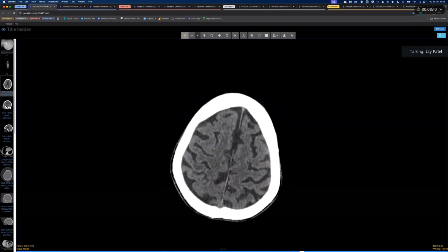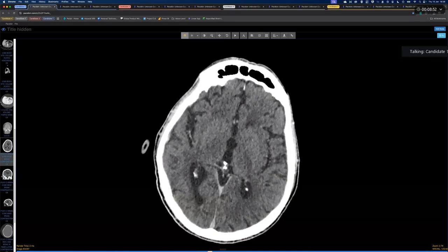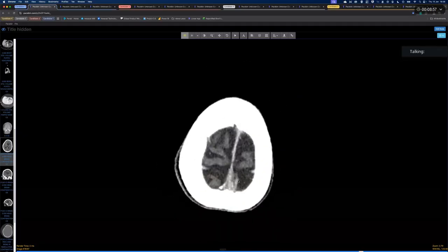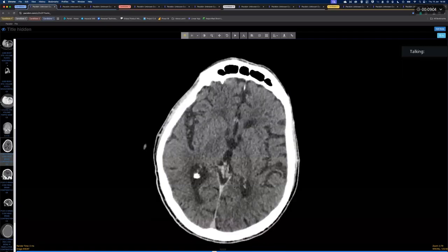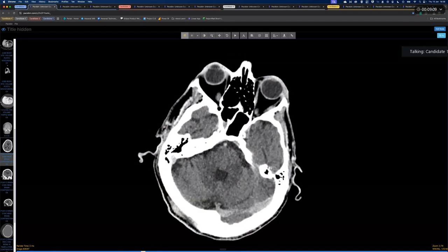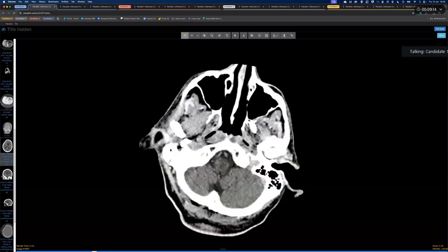Okay, thank you. I'm just going to take control of the mouse for a moment. So you've requested a post contrast, and there you are. Could you just take me through the post contrast brain, please? Okay, so this is the CT for the same patient with contrast. This is the uppermost cut going down. And this is the area of concern. So no masses could be identified.